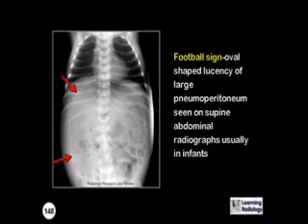What is the name of this sign? This is the football sign, the oval-shaped lucency representing a large pneumoperitoneum.